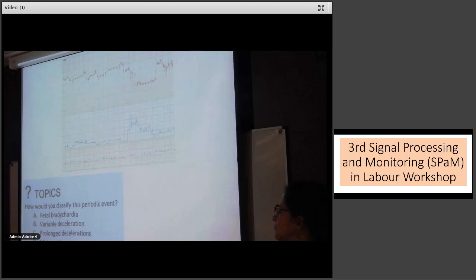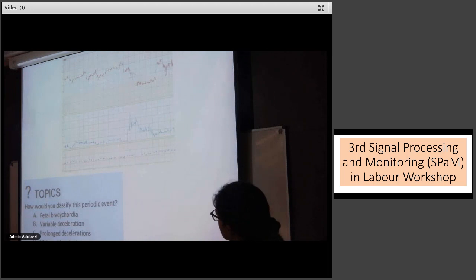What I think is quite evident is that it recovers quite quickly and it goes on to have normal variability. So where I would probably be somewhat worried in the middle of the deceleration if I didn't know what was going on after that, the fact that it recovers quickly and regains variability is, for me, relatively reassuring. So I carry on monitoring in spite of having just one prolonged deceleration. It seems to be occurring with a contraction. For some reason, they're not monitored before, although there were contractions. Otherwise, you wouldn't get the deceleration. But so I would readjust the TOCO and carry on monitoring.